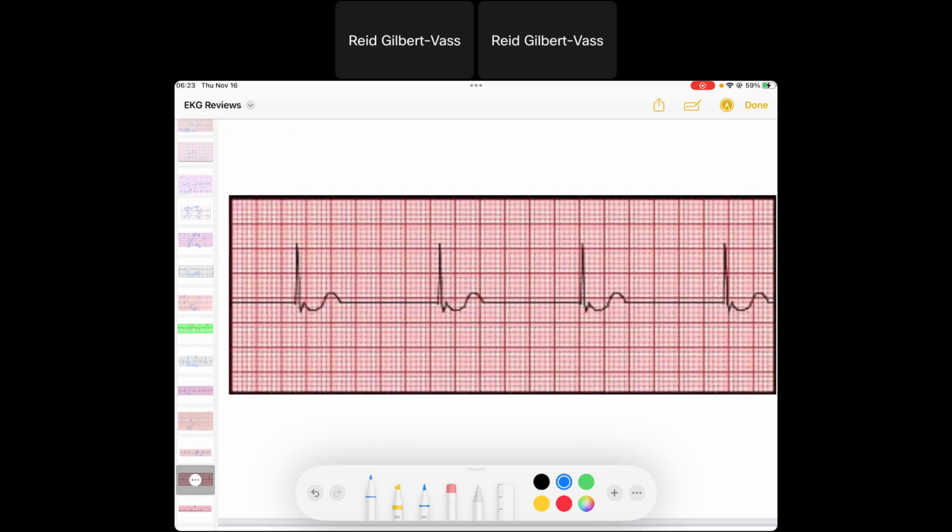Okay, here we have a slow bradycardic rhythm. We've got 300, 150, 75, 60, maybe 52 beats per minute. I don't see any atrial activity in front of it, but I see maybe these retrograde waves. They could be retrograde P waves. These are narrow complex QRSs, so this is a junctional escape beat or a junctional escape rhythm, and that's our rhythm.